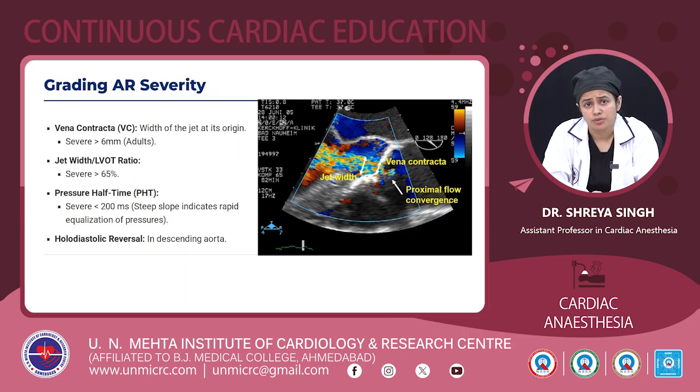Grading the AR, usually this is done in adults. So we measure the vena contracta. A vena contracta width of the jet at its origin more than 6 mm in adults is considered severe. Then we have the jet width by LVOT ratio, more than 65%, again considered severe. The pressure half time less than 200 milliseconds is again considered severe, or there is a holodiastolic reversal in the descending aorta.